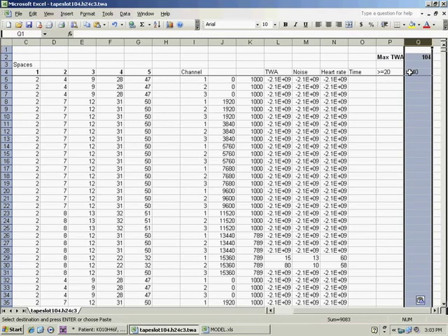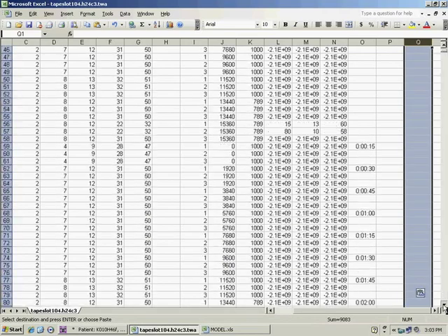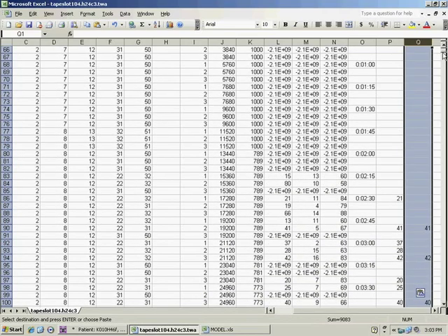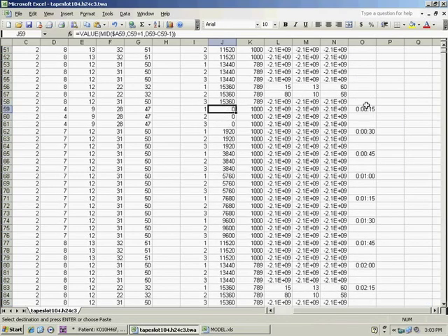It's very important to make sure that the start time of our file corresponds to the real start time of the recording. Just check if the last zero that you find here in this column after the channel column, so it will be this one, matches your start time of 0 hours, 0 minutes and 15 seconds. In this case we are correct.